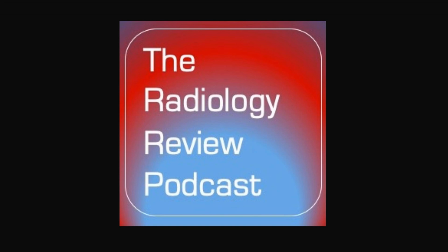Next, true or false? A simple bone cyst is typically eccentric in location. The answer is false. Aneurysmal bone cysts are typically eccentric in location, whereas a simple bone cyst, which is also termed a unicameral bone cyst, is typically centered in the medullary space. Simple bone cysts are most classic in the humerus and are about 90% located within long bones.